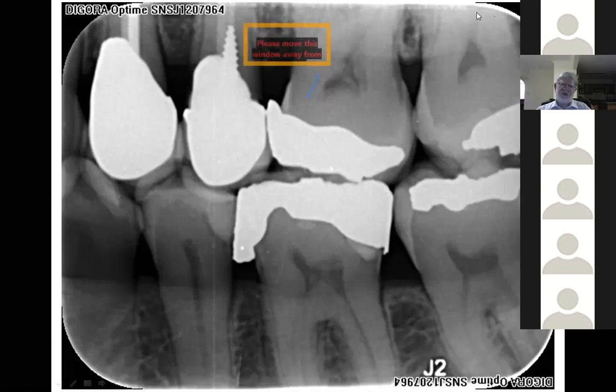How much damage have they caused? Okay, right. So we're getting minimal perio, minimal to no damage. We said this patient's 70 years old. You're seeing her, and those amalgams have been there for 55 years on the 2-6 and the 3-6. What would you do?